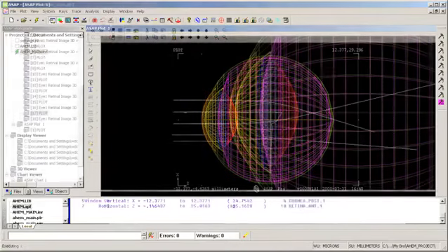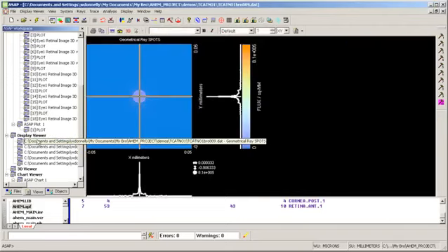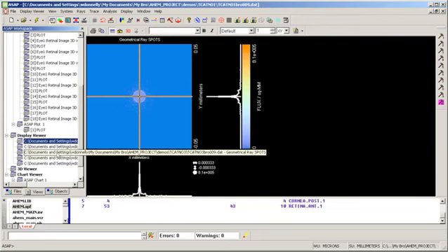All right, so I get a graphic here where I show some rays scattering, but I'm really interested more in the retinal PSF. So this is it here, and if we look at the numbers here as far as maximums go, what I've done is I've set various levels of scatter attenuation. So my particle size is staying the same, but I'm increasing the density of the particle size in the eye lens. So I've got 5 different levels of cataract set up, much like you would for nuclear cataract.